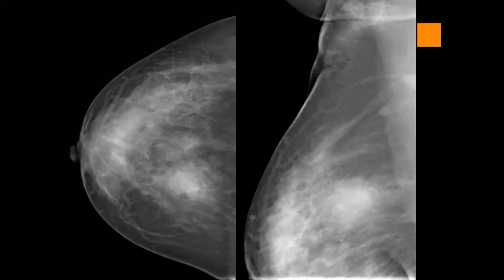Sometimes you need to describe the lesion by one descriptor. What is the most important descriptor for this mass? Spiculated. What is the spiculation? Posteriorly. Where is the spiculation? Posterior aspect of the mass.